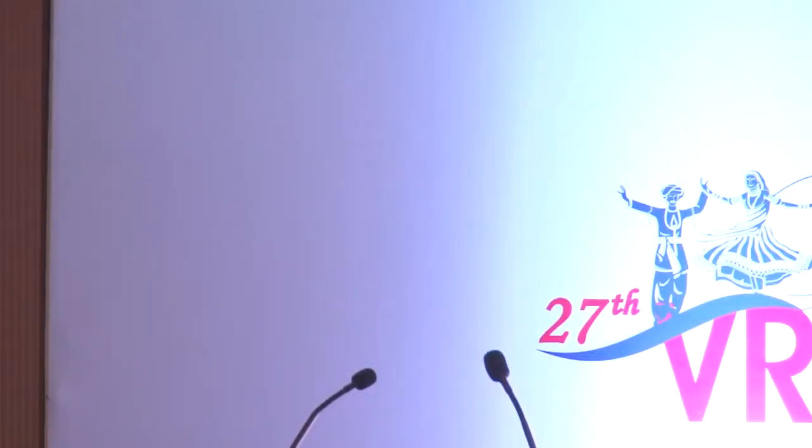If I could just make a quick comment. That was an excellent summary. Nice presentation. I think one of the things we should consider about outer retinal tubulation, and this is something we found through histology, doing direct clinicopathologic correlations with Dr. Christine Curcio, is that this is really a Mueller cell-driven process. And you can have outer retinal tubulations that don't have a single cone cell. So it's really what you're seeing around the border, the hyperreflective border, that's the tight junctions, that's the Mueller cells, okay? And you can have just a few photoreceptors.